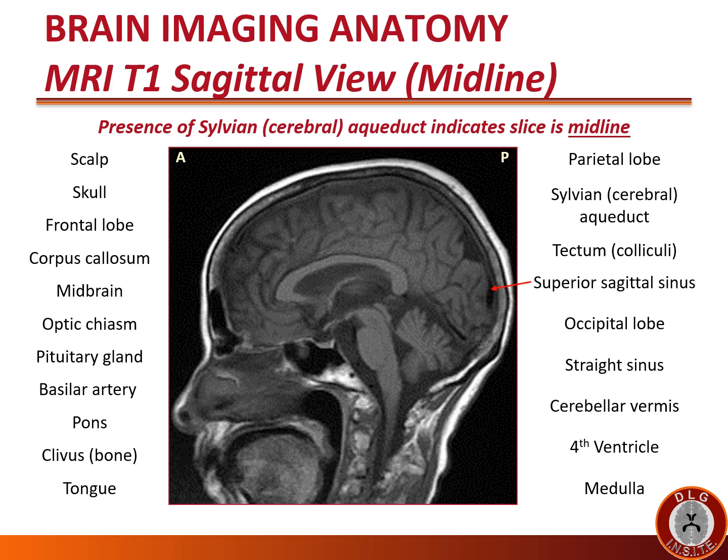The black tube in the midline, running just underneath the scalp, is the venous structure, the superior sagittal sinus.